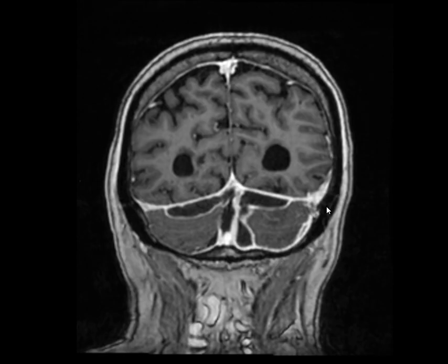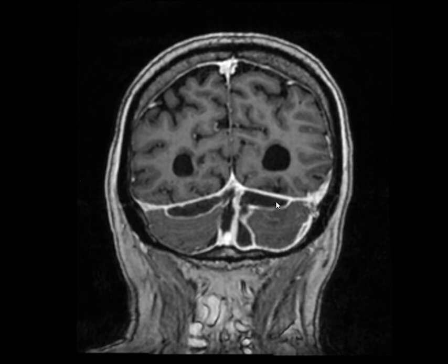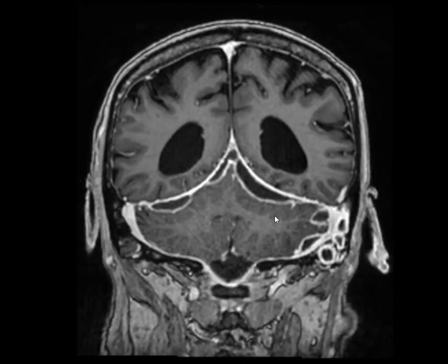So this was a case of acute otomastoiditis with subdural collection, subdural empyema, and left cerebellitis.